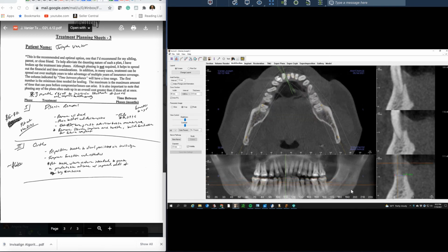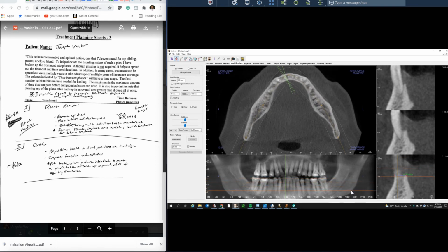I often will take this line and put it at the top of the best bone, and then I look over here and I say, if that's the top of the implant, what kind of crown to root ratio am I going to have? Well, implants do fine with crown to root or crown to implant ratios much larger than natural teeth. That's been studied quite a bit, especially if you control the occlusion. But to me, it's more of a cleansability issue.